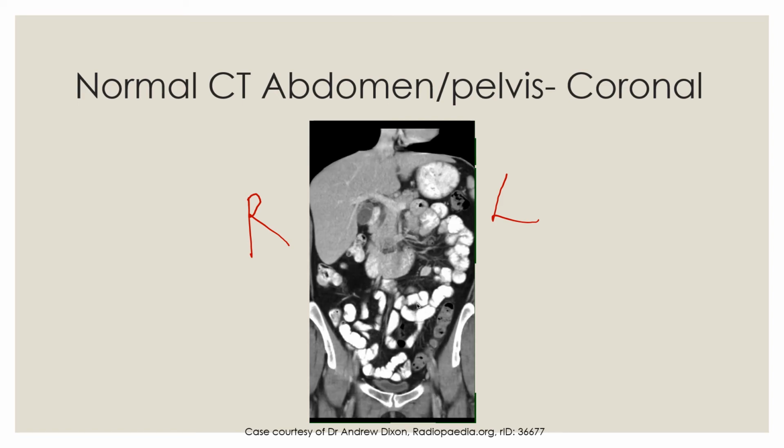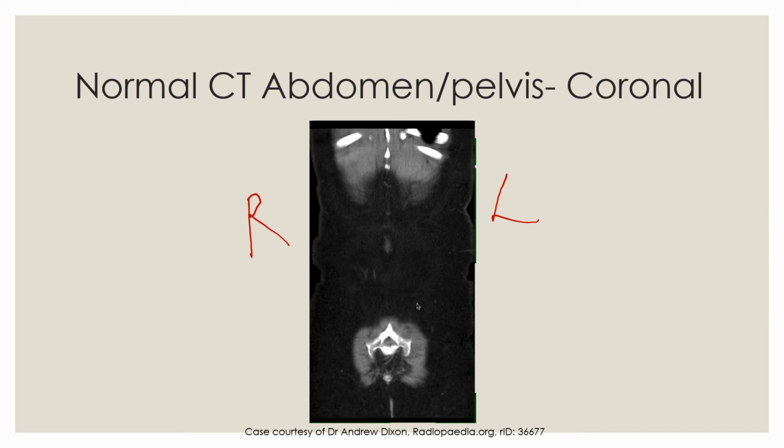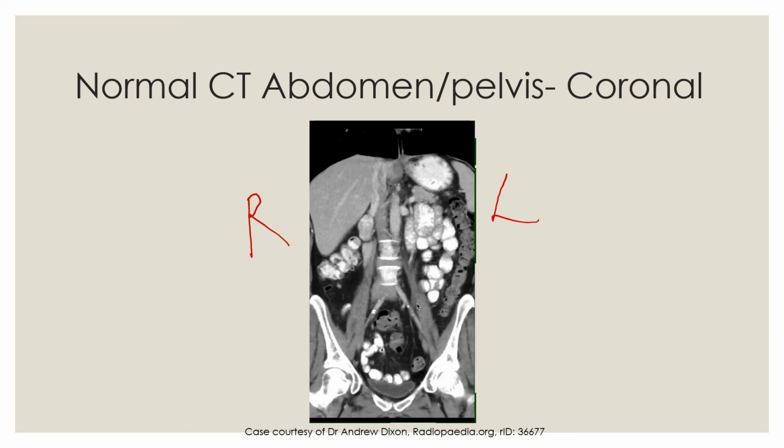And if you follow the bladder up, we'll see our kidneys. The base of the lungs are also visualized here, which are black, as I mentioned previously. Black things are as a result of most x-rays passing through from the tube and into the detector, showing black, and the white things are things such as bone and contrast material, which block x-rays and thus appear white.